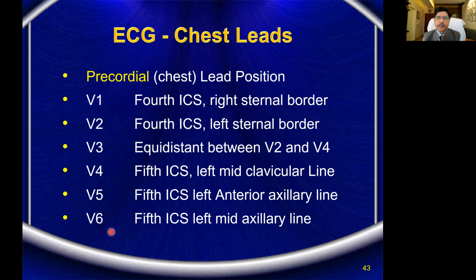Only one thing is left, which is the AVR. AVR is called the cavitatory lead, which is a reference lead and which is normally not used. Normally, AVR deflection is always negative in the ECG.